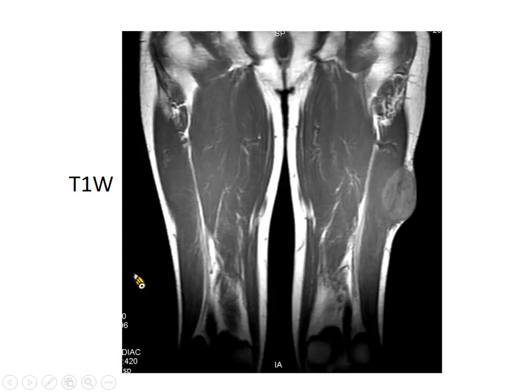The first step for everyone is to compare the signal intensity, whether it is higher or lower than that of the adjacent muscle. Everyone can recognize it is higher. So the differential diagnosis can be narrowed down to certain substances, like fat, melanin-containing lesions, and macromolecular substances.